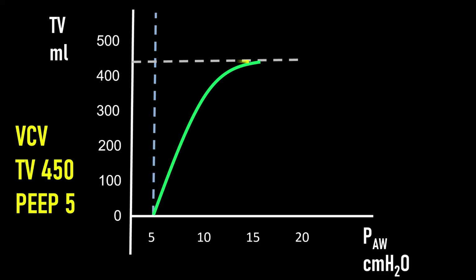What's going on here? The inspiratory curve looks normal. It's the same as you've seen on previous cartoons, but there's something wrong with the expiratory curve. It goes back and it looks a bit jittery and then it kind of rolls downwards. So there's a problem with expiration. And when you see a problem with expiratory flow, you think about increased airway resistance, particularly bronchospasm.